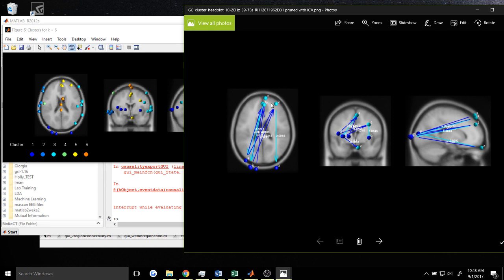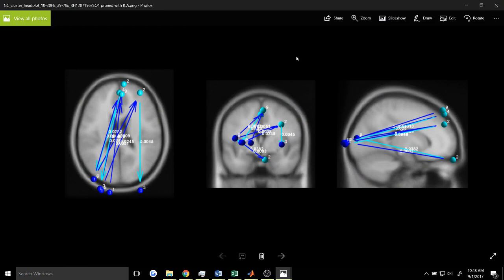So for each subject, there are specific sources which have been classified into this cluster, and I'm essentially overlaying those connections here to see an overall frontal occipital connectivity on the group level. And we have the 3 views here, and we have the color scheme I had mentioned before, where the connections originating from, for example, the frontal sources here are the light blue, and originating from the dark blue occipital sources are the dark blue arrows here.